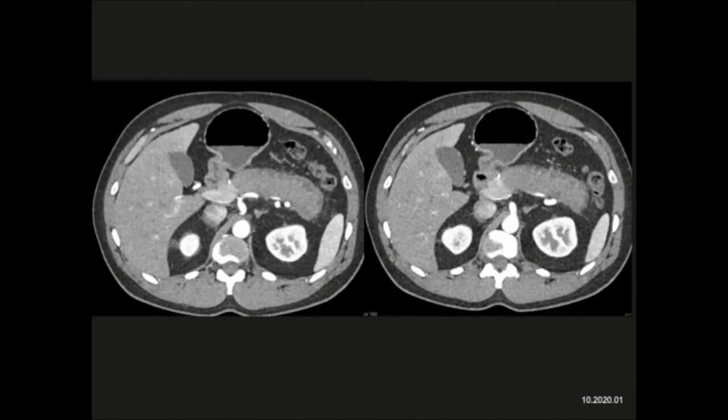They each have that word. But to be more precise, the halo around the lesion, the diffuse edema, is classic for acute pancreatitis, but it's really classic for autoimmune pancreatitis. And so with autoimmune pancreatitis, you have a halo, you have diffuse enlargement of the gland. Remember, treatment with autoimmune pancreatitis is simply steroids for 2 weeks, and then the pancreas will decrease in size.